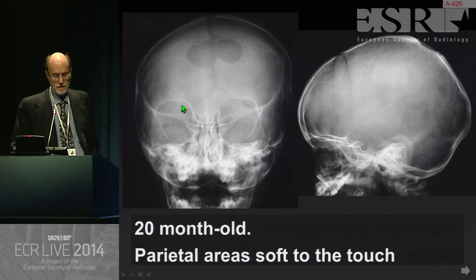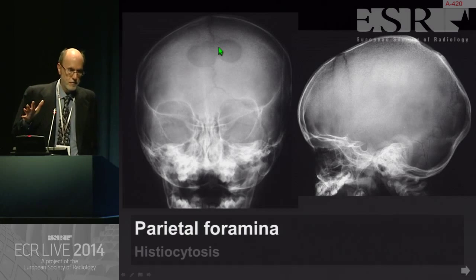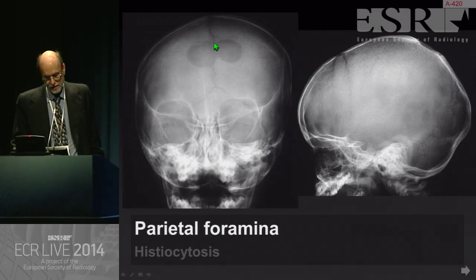In this case, there is a very clear-cut abnormality. There are 2 areas of lytic lesions which are close to the midline. So these are not histiocytosis. These are clear normal variant, well, normal to a certain point, because these are tender parts which can be dangerous for the patient because there is no bone overlying these areas.